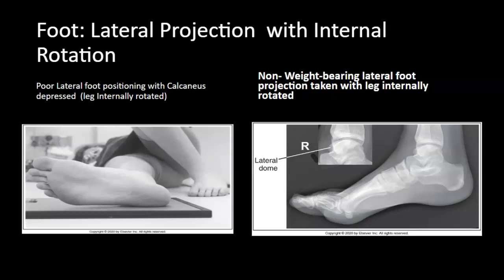So let's look at internal foot rotation on a lateral projection.